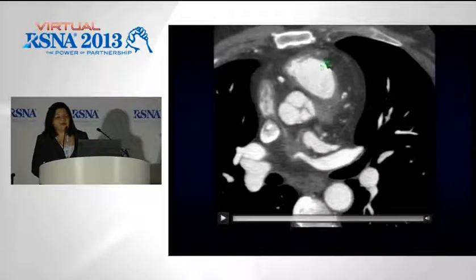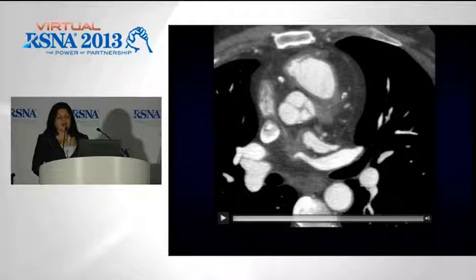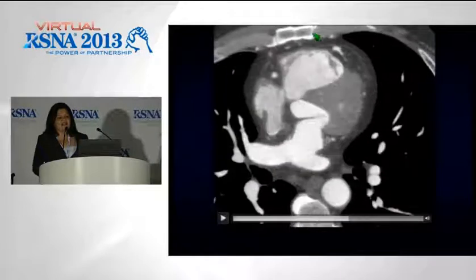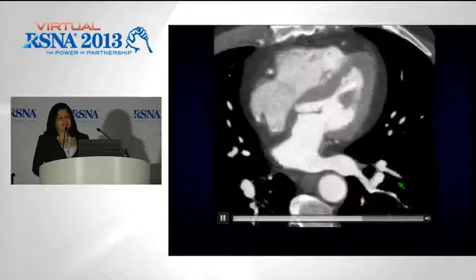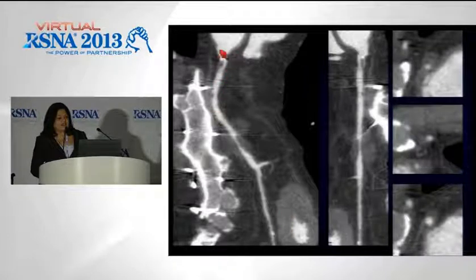Look at it there. So this gray stuff, is this non-calcified plaque causing such narrowing of the graft, or what is this? And then it's a little bit dilated and then normal caliber as it's going to the LAD. So when we look at this, you've got some disease proximally, not significant, but here you've got a critical stenosis, and you do not see plaque so widening up the vessel. So what happened in this patient was, usually you have some retrosternal fluid and some postoperative changes. Perhaps this one became a little inflammatory, like you would with a phlegmon or things like that you get elsewhere, and then it led to narrowing of that vessel there.